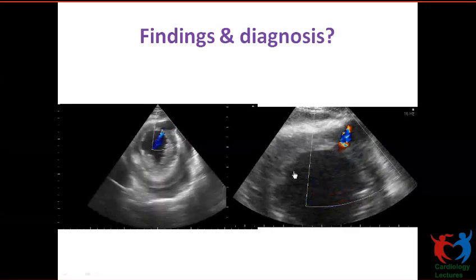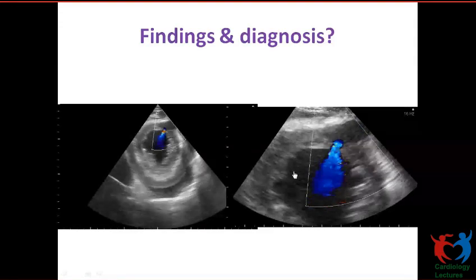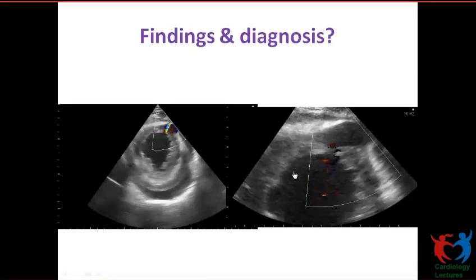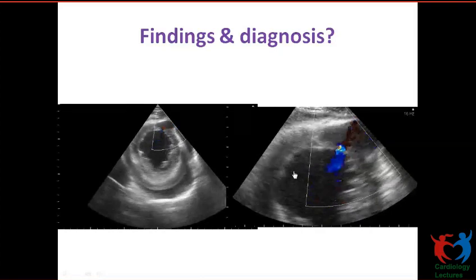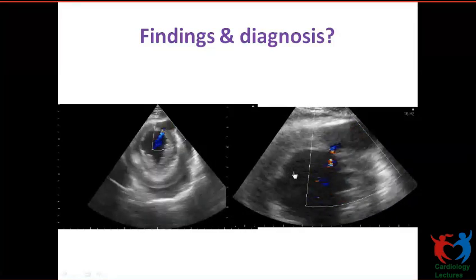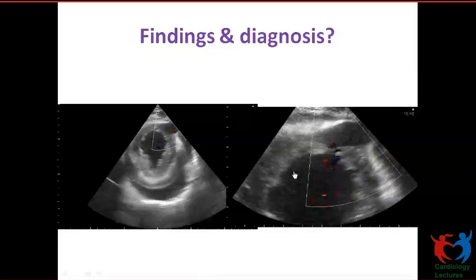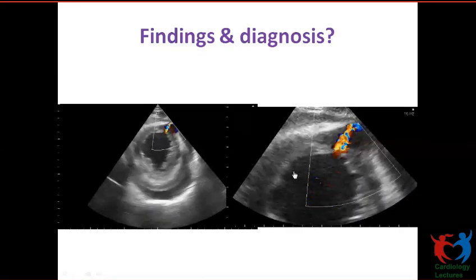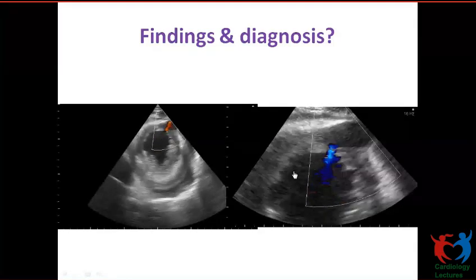So can anybody take this? Ma'am, parasternal short axis view showing the ventricular septal rupture. Aneurysm, ma'am. No, it is an aneurysm. Can you see there? It's moving in and out. Sorry, it's the other side. Pseudoaneurysm. Blood moves from the LV into the pseudoaneurysm with a narrow neck.